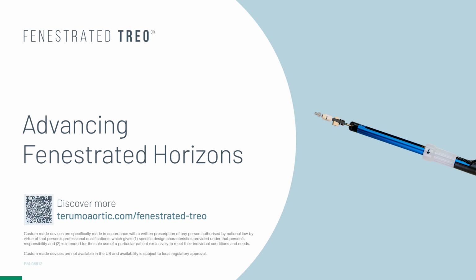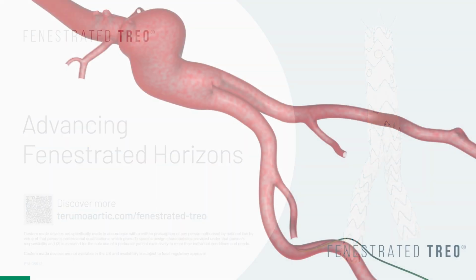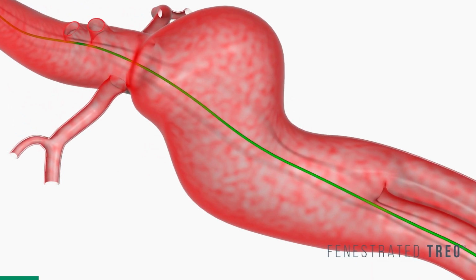The main bifurcated stent graft is implanted first, followed by the bridging stents, contralateral leg extension, and then the ipsilateral leg extension. After the patient is properly positioned and appropriate access is achieved, introduce a 0.035-inch stiff guide wire into the artery and advance it into the descending thoracic aorta.